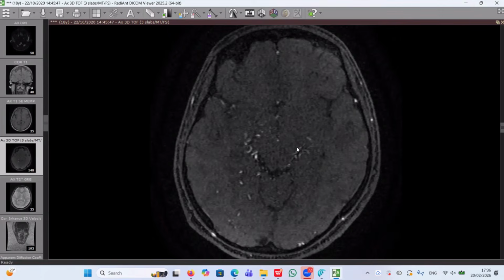You can raise the two possibilities in your report, Moyamoya disease or Moyamoya syndrome, because the clinician should search for any association or underlying cause for this Moyamoya pattern.